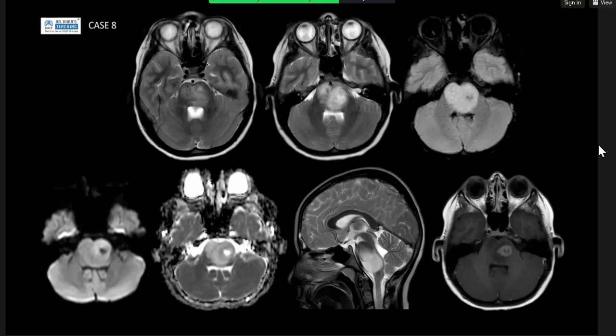I think I will go with brainstem glioma, the first for me, a glioma in this region. So I am suggesting it could be this, with focal necrosis, something like this, or myelinolysis, something on top of this pathology. Yeah. Okay. So good.